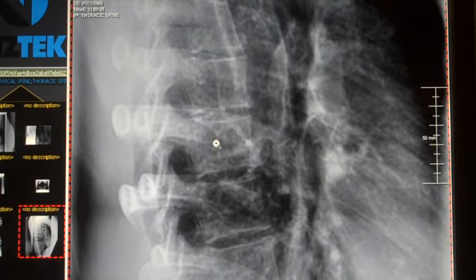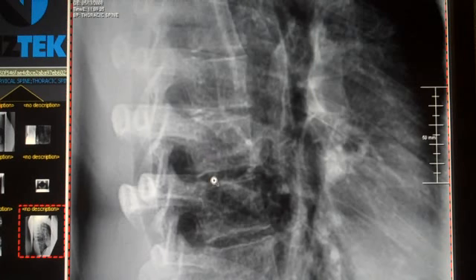My name is Dr. Bradshaw, and this film is intended for my RAD 1611 group and for review for my RAD 2612 group. Right now I'm looking at a close-up on a lateral thoracic view. I'm looking at a digital from the outpatient clinic. Wanted to show you this so that you could see the digital image and what it looks like.